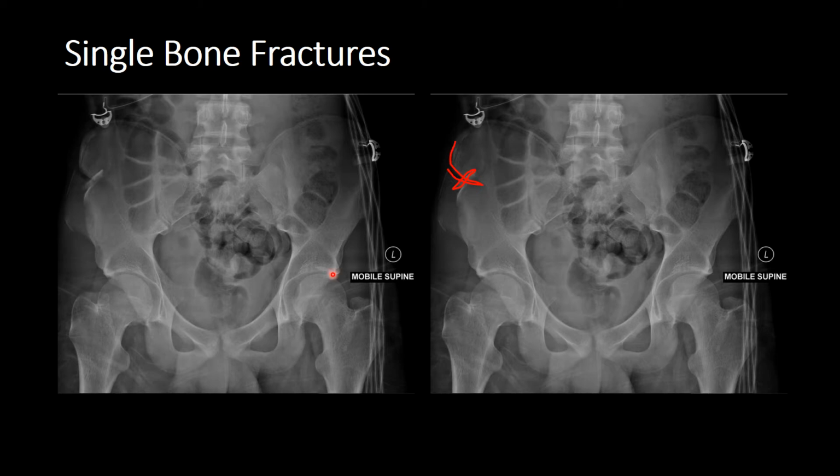You want to carefully scrutinise your acetabulum, which includes your roof, and the anterior and the posterior cortex. You want to look at your SIJs and check your sacral foramina, which might indicate an underlying sacral fracture. And when you're carrying out this search strategy, it will be checking the outer contours that will enable you to identify the Duverney fracture.